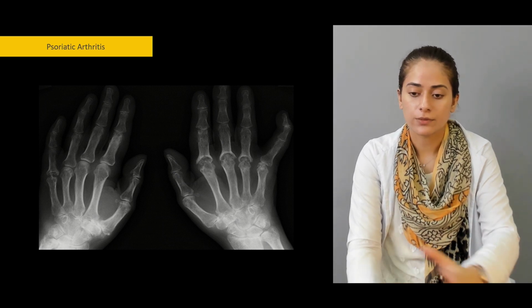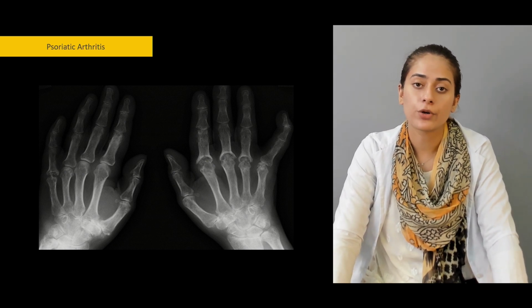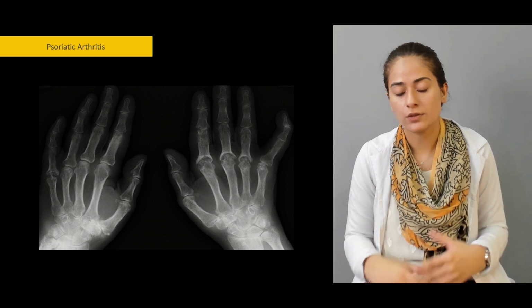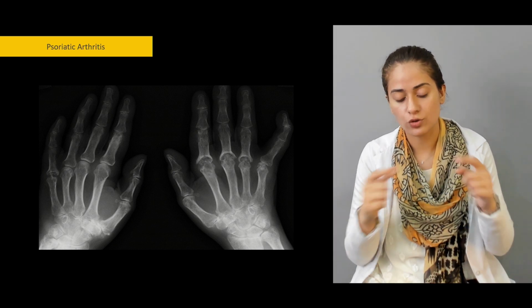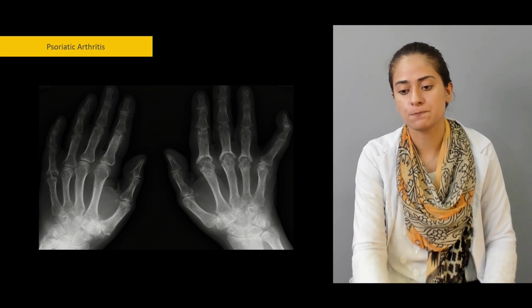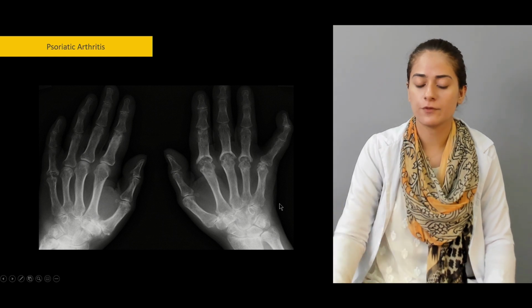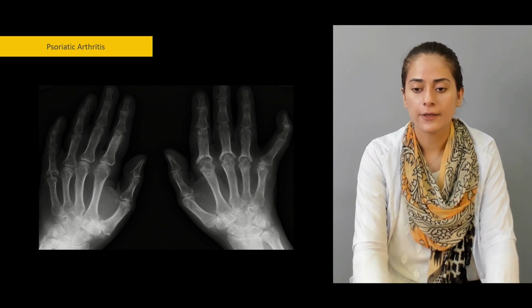The underlying osteal changes will be the same as they were in OA: joint space narrowing, all the characteristics of OA that we just discussed, sclerosis, osteophyte formation, osteocartilaginous body formation within the joint surfaces, which will further increase the friction. As we can see, there is joint space narrowing here, almost no joint space here. So all the same features, and on top, skin involvement. So that is worse than OA.